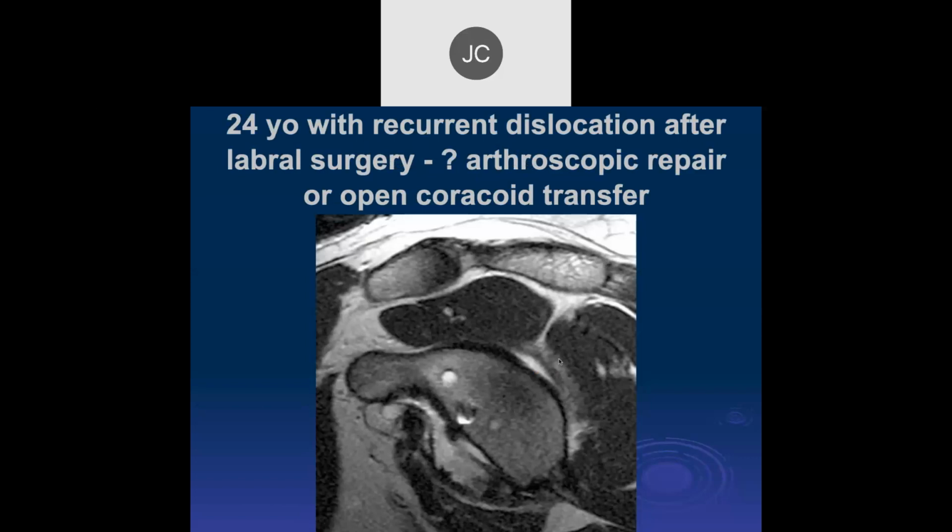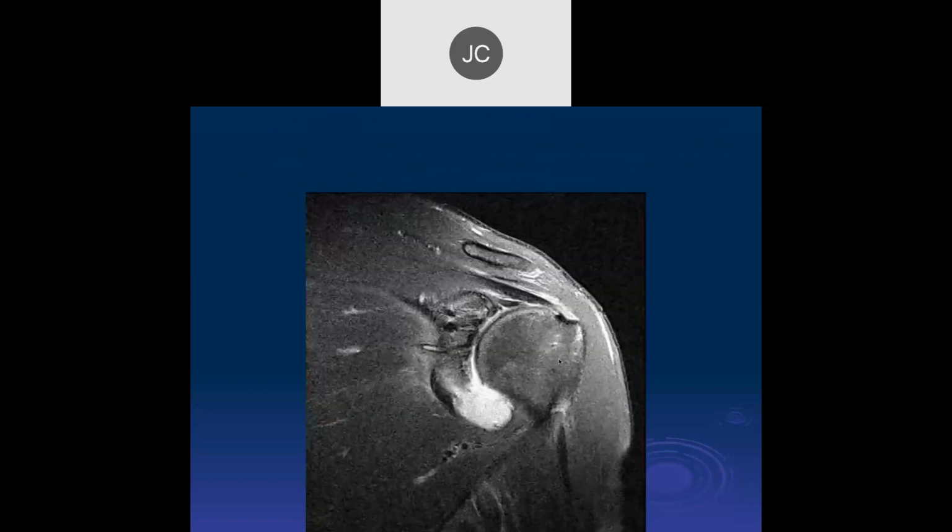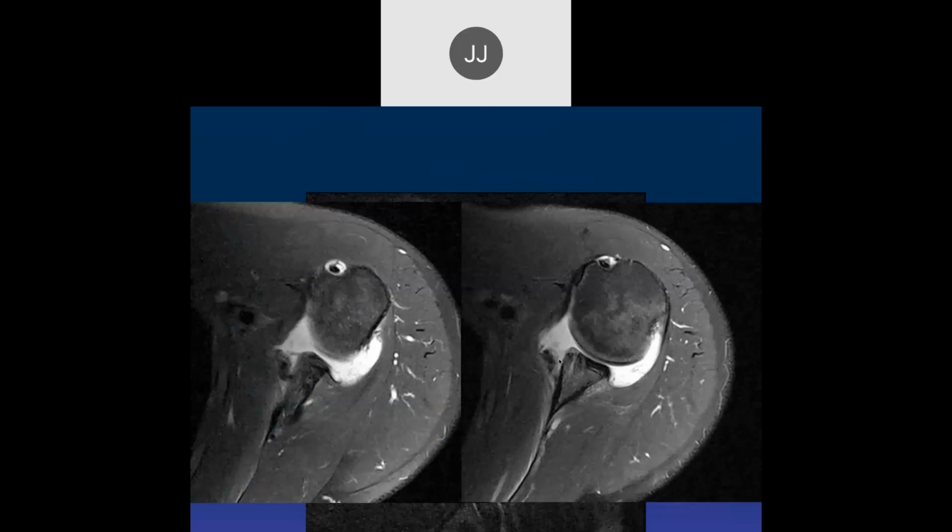Okay. Hold on. Wait, was it back in place when they did a repair? This is after the repair. Here are the suture anchors. This is post repair. So this is actually thought to be a re-tear after the surgery.